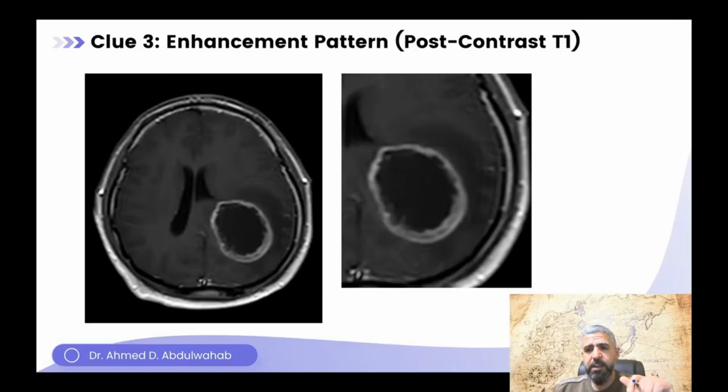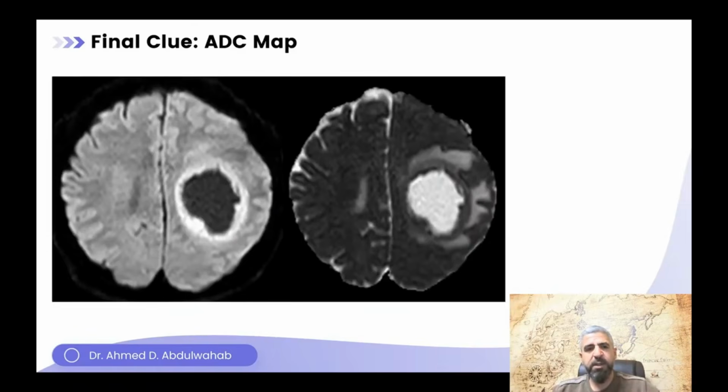Look at the enhancement. Is this a thin, smooth, ring-like enhancement, an abscess for example? Is it a solid nodule? What kind of enhancement is that? Solid, ring, or nodule? Thick ring enhancement. Exactly. It's a thick-walled ring-enhancing lesion. Someone asked for a diffusion. This is the diffusion. As I said, this is vasogenic edema, so there will be no diffusion restriction. As you can see here, the edema is showing nothing on diffusion, and it appears hyperintense on ADC, apparent diffusion coefficient. Sorry.